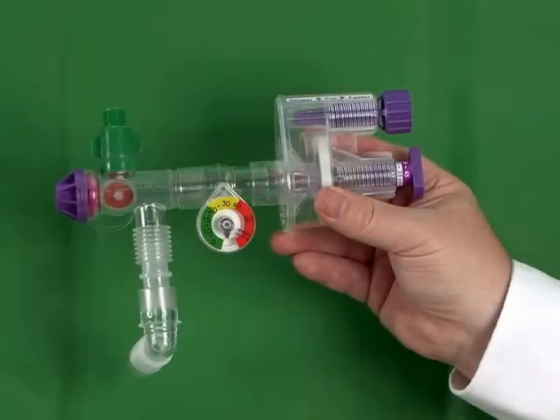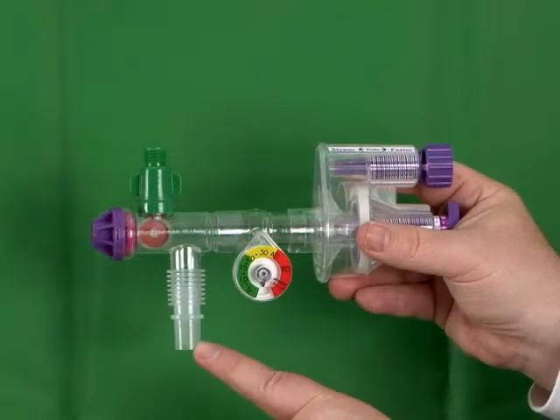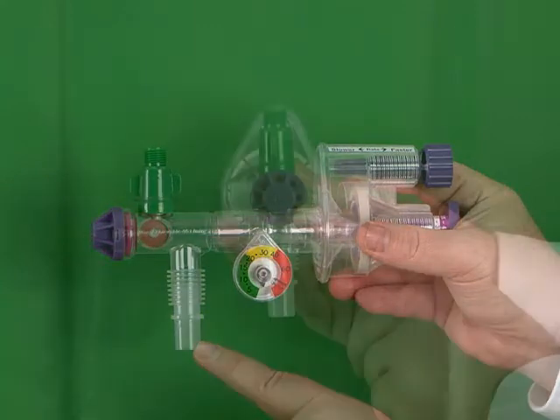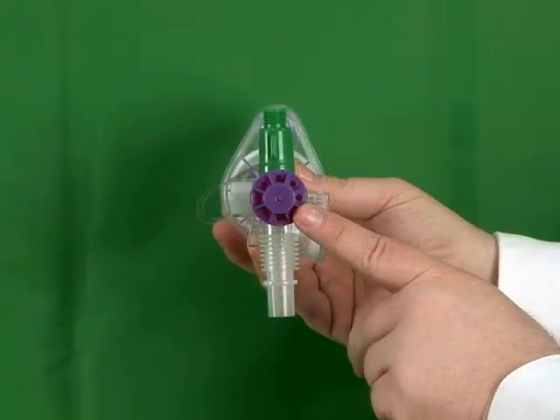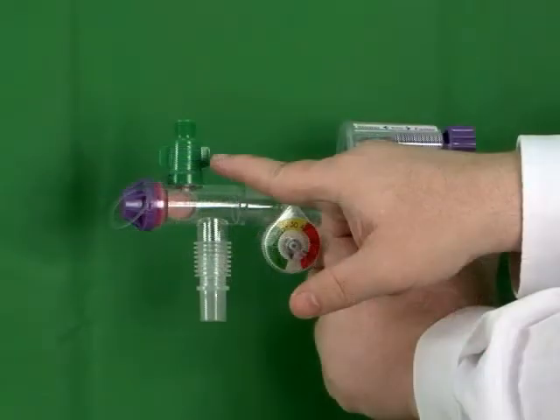The automatic resuscitator is a disposable device that provides consistent hands-free, constant flow, pressure-cycled ventilation and is easy to set up and use. The patient T of the automatic resuscitator consists of a patient connection port for connecting to a mask or endotracheal tube, a redundant pop-off valve which activates at 60 centimeters of water pressure, an air entrainment valve which allows the patient to entrain ambient air when desired, and a gas inlet for connecting to an adjustable 50 psig gas source such as a flow meter or oxygen flow regulator.